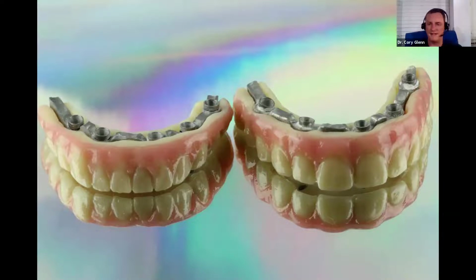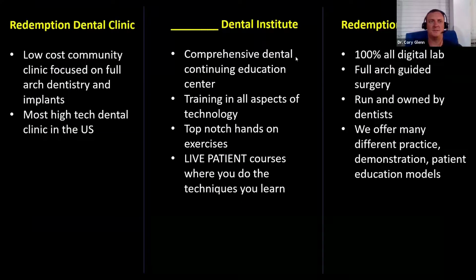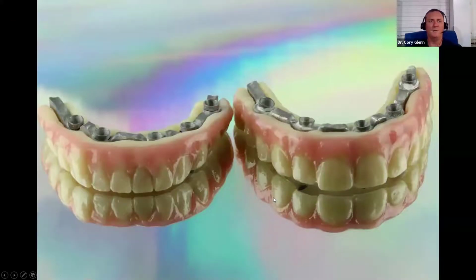And it's more passive than you're going to get with the best digital workflow and surely analog workflow, because of using that CAL technique. And then the whole restoration, all that is printed in Bego resin and Trinia, and then a sealer over the top of it. Man, I mean, talk about cheap. That's an excellent option.